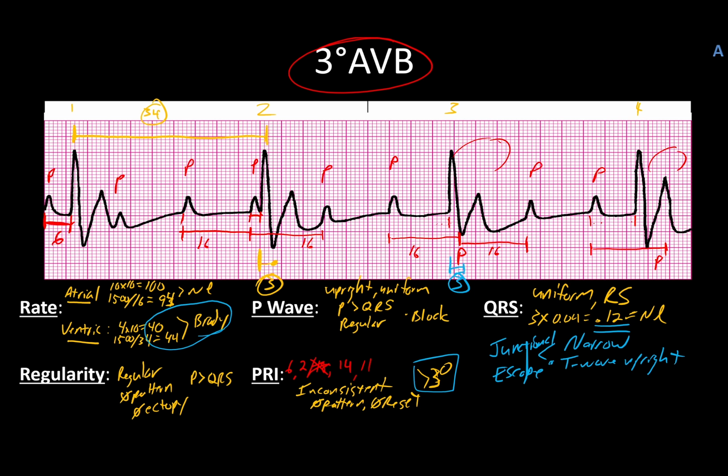Because at the end of the day, I'm going to intervene doing the ACLS protocol for bradycardia. Whether it's wide complex or narrow complex, slow heart rate doesn't really change much for us. We can still try atropine, it won't work.